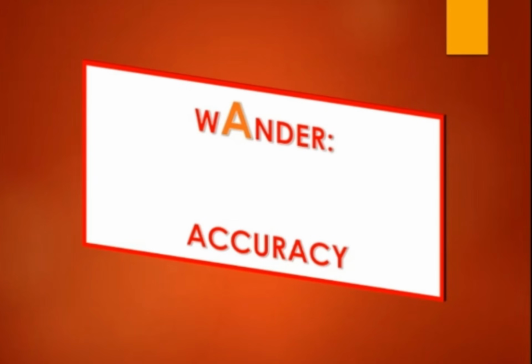For the fast threshold, the test lasts less than 5 minutes compared to the other strategies used, like the full threshold, which can last up to 20 minutes, because the full threshold tests a particular location up to 5 times, by graduating the luminance up or down until the patient is able to capture the stimulus presented.